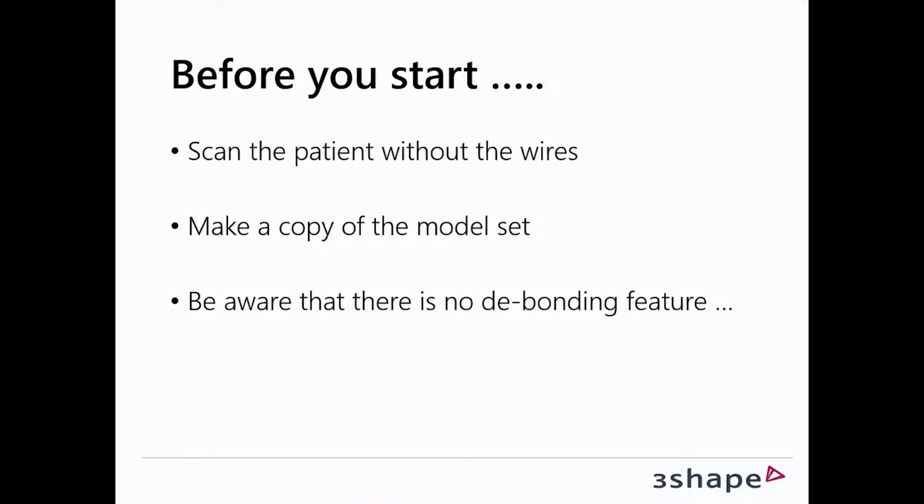And thirdly, be aware there's actually no debonding feature in the ortho system, and you may think this is strange having a video about a feature that doesn't exist, but actually we're using an existing feature in the ortho system for doing debonding, and R+K will show you just in a minute how that works.